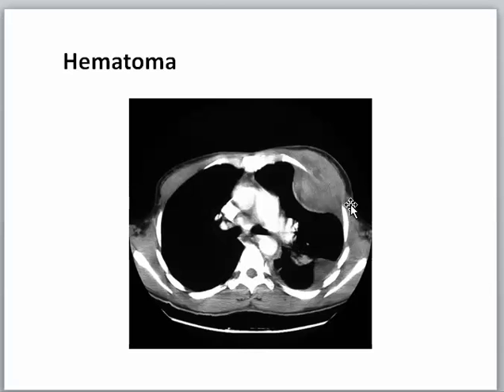And here we have the soft tissue opacity around a rib with lung contusion and minimal pleural collection, and there is increased density within that soft tissue, denoting the blood collection of the hematoma. So there is hematoma around the rib associated with lung contusion and minimal pleural collection.